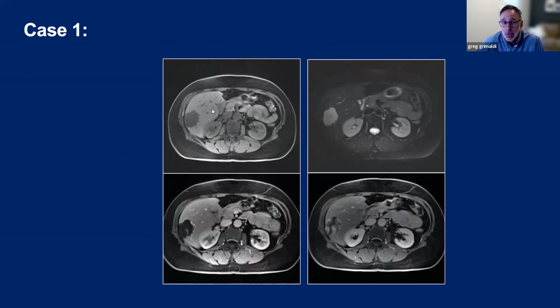And in the right lobe at T1, I see a well-defined lesion in the right hepatic lobe. At T2, it's markedly T2 hyperintense and homogeneous. Homogeneity is important for this diagnosis. It's not quite as bright as the fluid in CSF, so I don't think this is a cyst. It's not a cyst because I see enhancement at post-contrast early and late. And the enhancement pattern that I see is sort of a peripheral discontinuous nodular that puddles at delay. And so this is the classic appearance of a hemangioma.